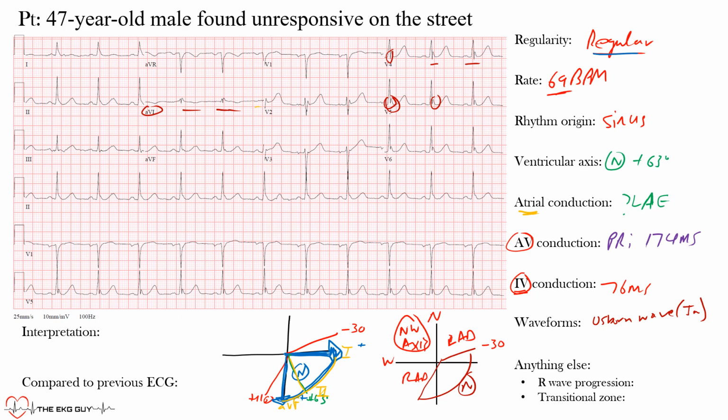All right, so anything else? Okay, no ventricular ectopic beats, no inverted T waves that we should point out, no ST depression or elevation that we see here, no PR depression or elevation that's significant. So not much else going on here. All right. How about anything else? This is something that I use if there's something glaring that I've missed, or just a chance to review it again.